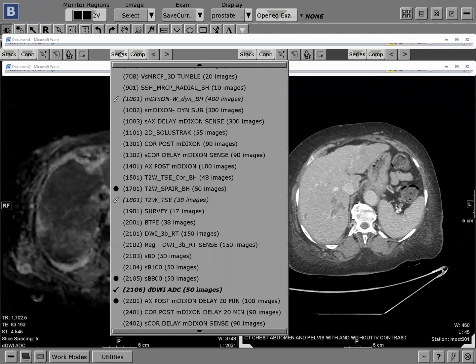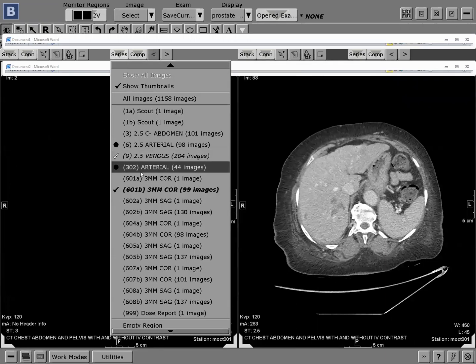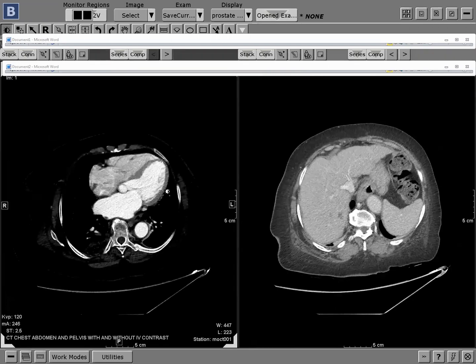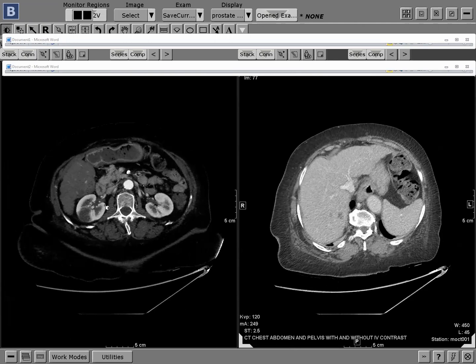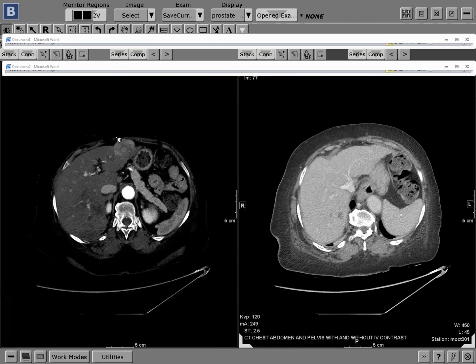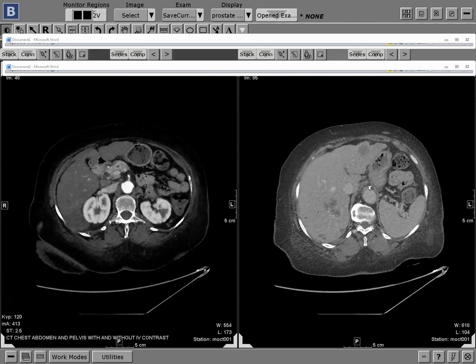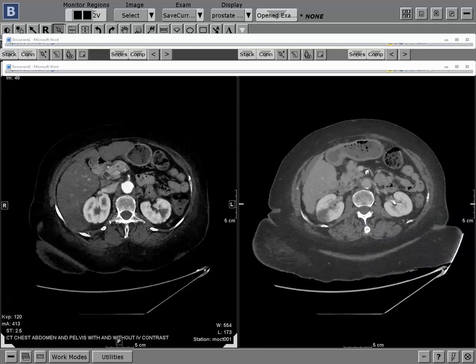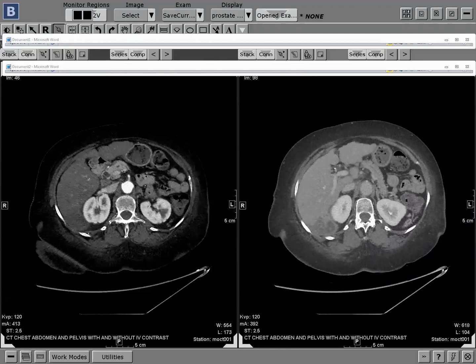So I don't know why this patient has this kind of hypercoagulable state, but she does because she presented with this massive PE, and she has renal infarct. So this is our working diagnosis at this point, that she has a focal HCC, and then she has these large infarcts in the right hepatic lobe, which kind of mimic infiltrative HCC in this case.